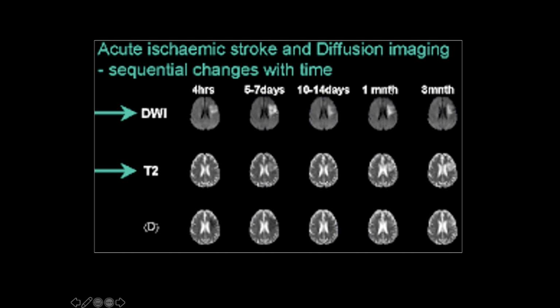After 1 month, 2 months, 3 months, the lesion is chronic. Therefore, after some time, we will not have diffusion restriction on the DWI anymore. The signal is very high on ADC, and after some time on T2, we will see a porencephalic lesion. Therefore, the remnant of what the ischemic stroke has been.